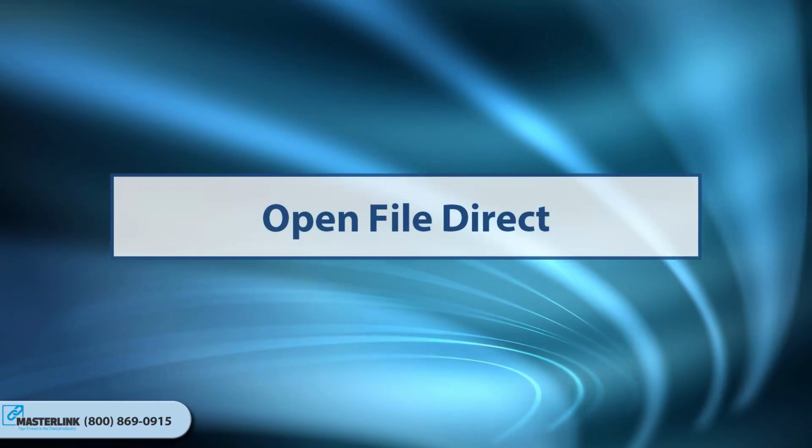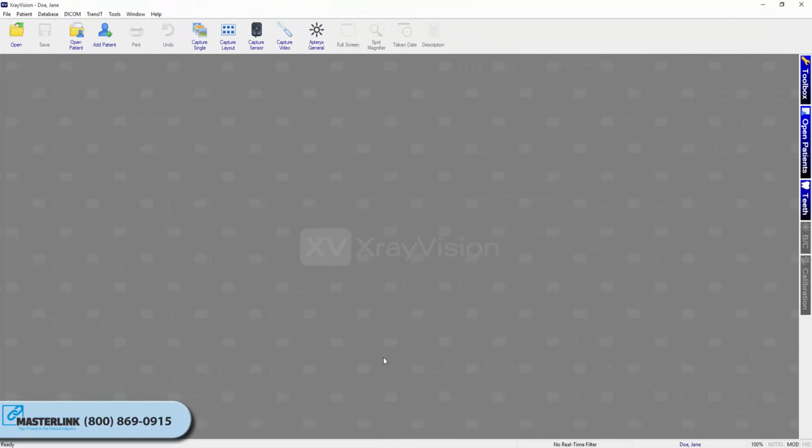Open File Direct. This option is used to locate and import an image file from a known location on the computer and associate the file to a patient.